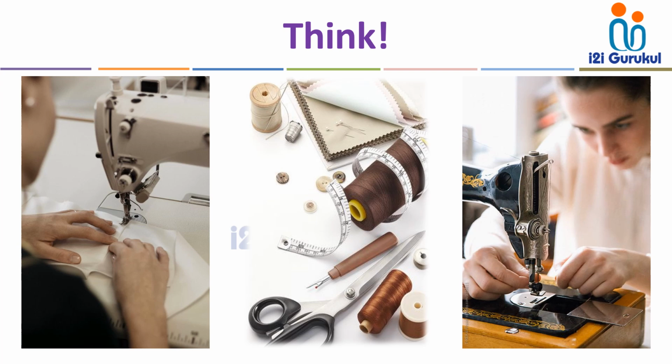Okay, coming to the point: for the optometrist, ophthalmic technician or an eye care practitioner, when we do a refraction, we need a trial set. Here, the tailor requires these accessories to make a dress with the sewing machine. So, like that only, we require a trial set to complete the refraction for ophthalmic patients.